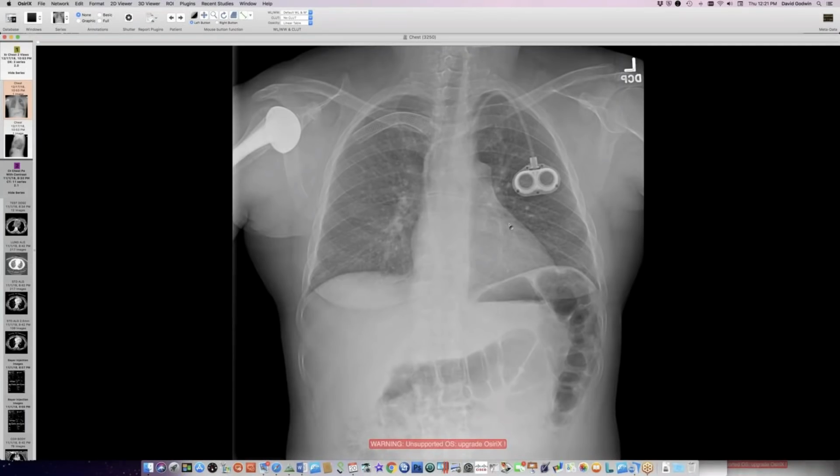And then here's a woman. So I saw this case shortly after seeing a case of azygous continuation. The previous case, reading out with the night resident one morning this week, was a case I've shown before of azygous continuation in the setting of situs ambiguous and liver transplantation. So the previous case is one I've shown you guys, and that had nice azygous dilation. And then the next case showed this case here with a very nice aortic nipple.